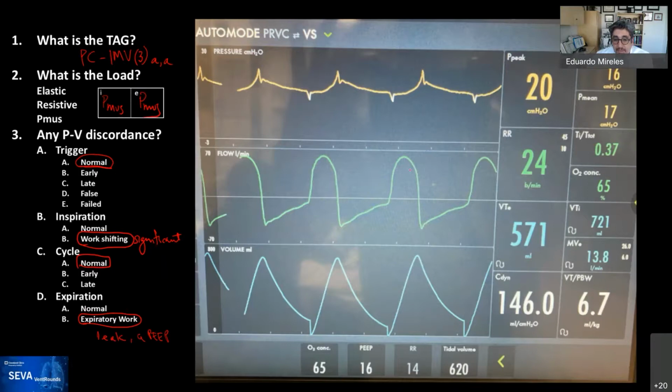Even though the patient, actually, this is one of those things that maybe it's food for thought. In general, is the absence of variability of this patient, right? It's doing a lot of effort continuously, same almost identical tidal volume, breath per breath, with same waveform. So breathing relatively fast with inspiratory and expiratory effort. So when I see that, it just tells me what's going on here. What's the metabolic derangement or brain derangement that this patient has to be undergoing this.